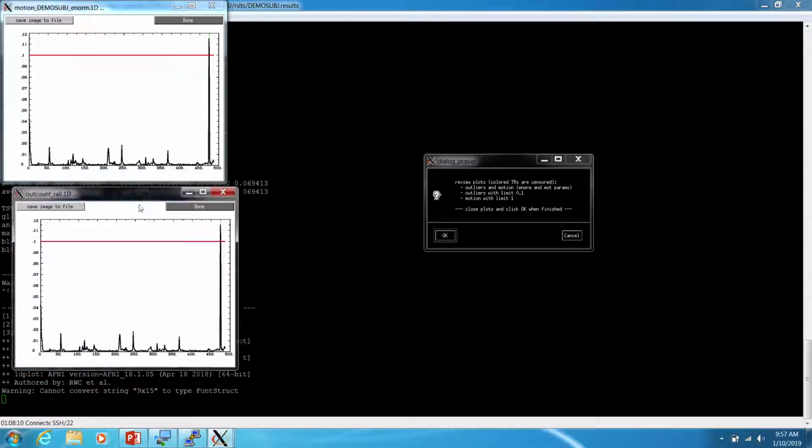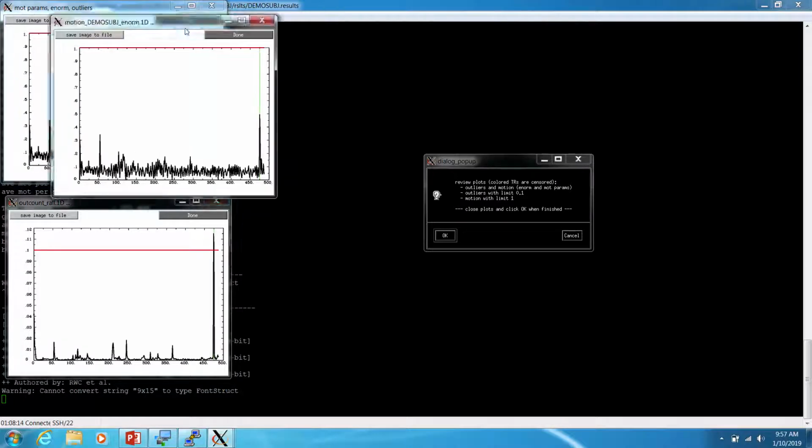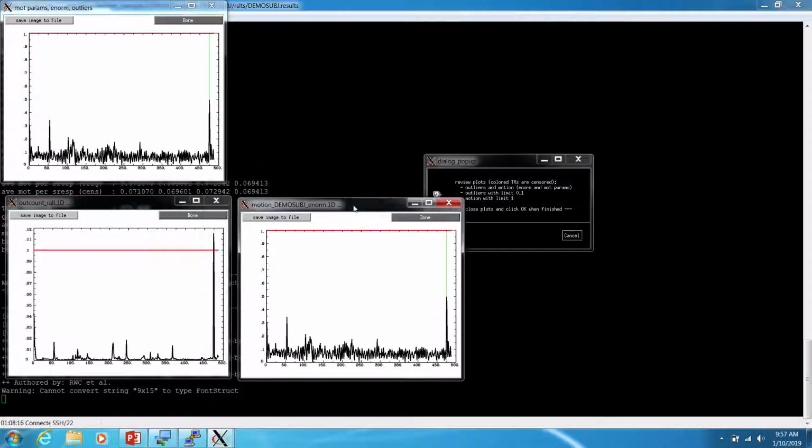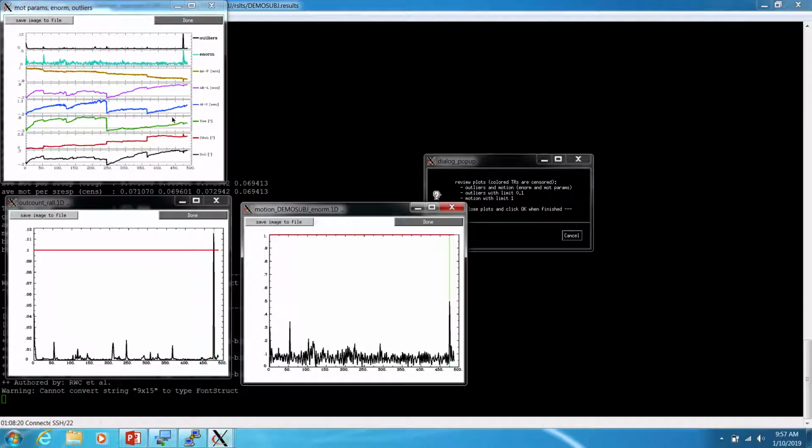Basically what we're looking at here, there are 3 of these graphs. So this is a graph of our signal over time, and this red line is that 0.1 cutoff that we talked about. Here's all the signal in our brain. At this point, there was so much signal that it was above our cutoff limit, and then it gets flagged.